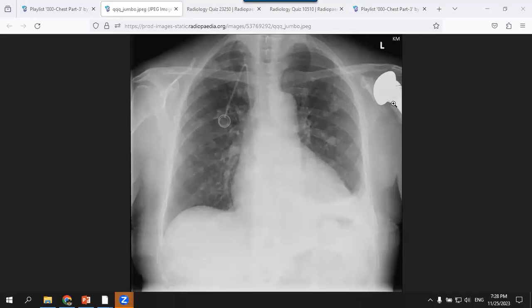You have to correlate all findings together. The main abnormality here is pulmonary nodules. Metastasis will be on top of the list. We will add portacath or tunneled venous lines. This may be related to chemotherapy. What about this? I should take history. Maybe a tumor like osteosarcoma, or maybe an incidental finding due to advanced arthritis.